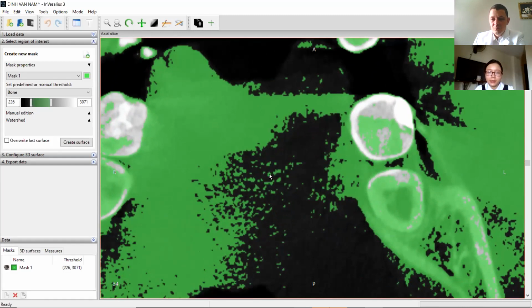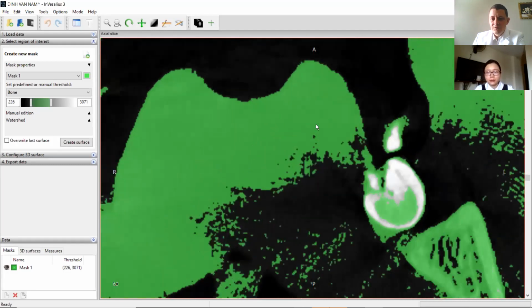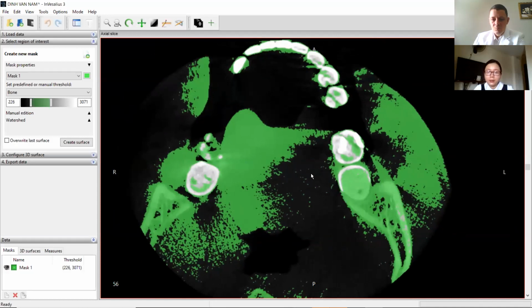Nếu mà mình ấn chuột phải thì mình có thể zoom nhỏ hoặc to ra. Okay. So that's done. Next, here we want to separate the mandible. That's what we want to do in this course. Hôm nay mình sẽ tách cái phần hàm dưới ra. Đó là điều mình cần làm khi mà mình làm cái khóa này.